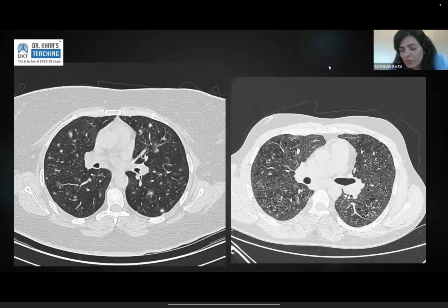Pulmonary nodules coalescing to form a patchy area of consolidation indicates benign etiology. It indicates granulomatous inflammation. So sarcoidosis can look like that. TB can look like that. Rarely, and unfortunately, even metastatic disease can look like that. But the word coalescing nodules is used for TB and sarcoidosis.